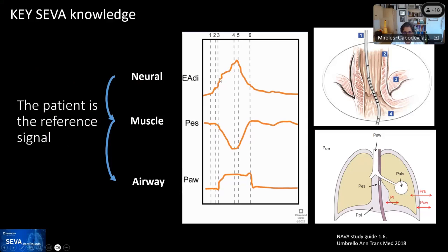And you can see here signaled by number 3 that there's a drop in pressure, and then there's the trigger of the breath, or that's where the breath starts essentially. And so that will help you see where the Pmus starts and then where it ends. And you can see that this breath in general ended all the way over here. You cannot see the Pmus because there's no flow signal, but you can use those signals.